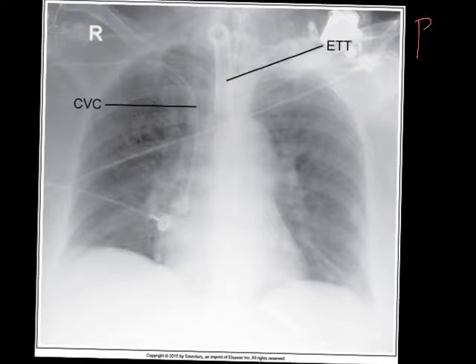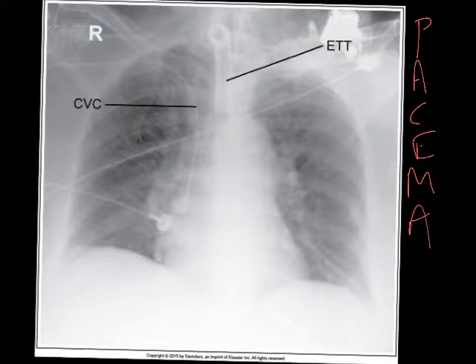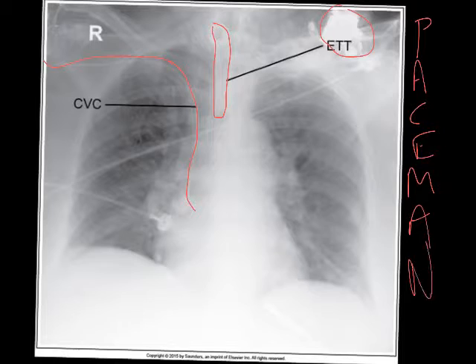So P-wise, what do we see? Positioning, the area that's covered, collimation, exposure, how's our exposure, marker. We've got some interesting foreign body type things going on, and some of these have been indicated, but I'll circle a few others. There's something going on there. You can see this here, and then this here going down and like that, coming in from the patient's right arm. And then demographics, of course.